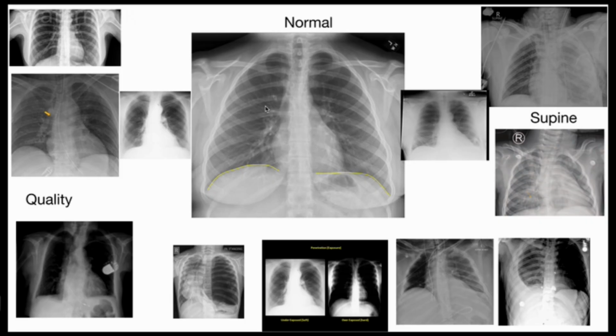Partial inspiration, of course, distorts not only the cardiac shadow and the mediastinal structures, but also prevents us from studying the bases quite clearly. So we insist on a fully inspired view.